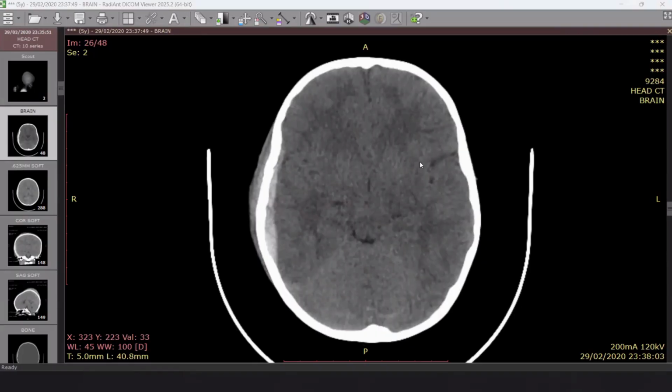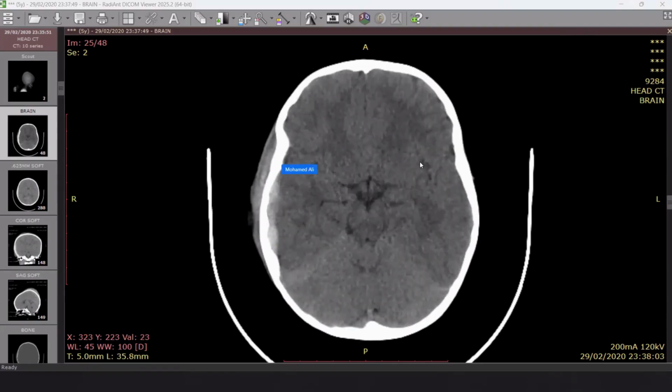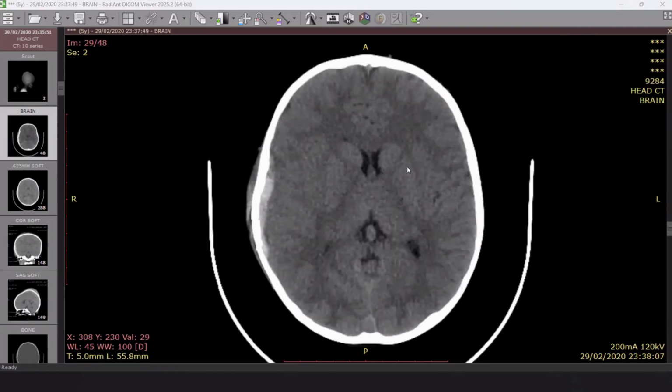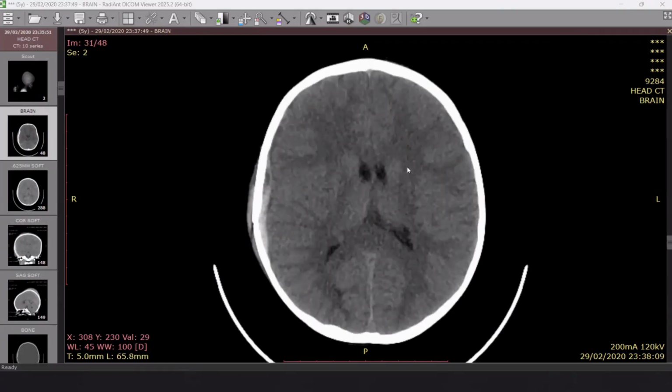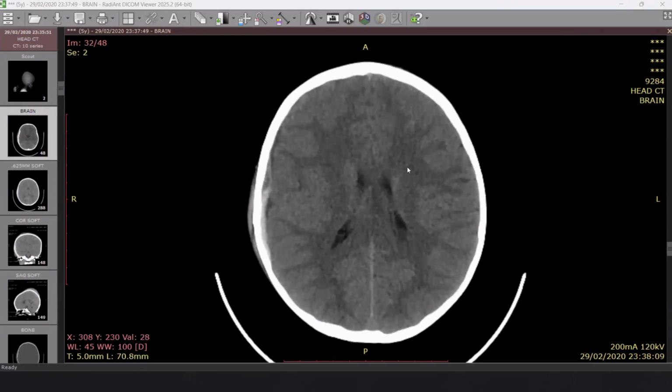Subdural hematoma, because we have here crescentic shape and crossing the sutures. We have a concave inner surface of the hematoma. Is that correct? Okay. Do we have any more data regarding this hematoma? Sir, I think that there is low intensity signal noted within it, representing swirl sign, which may suggest active bleeding. Very nice. Okay. Very good.